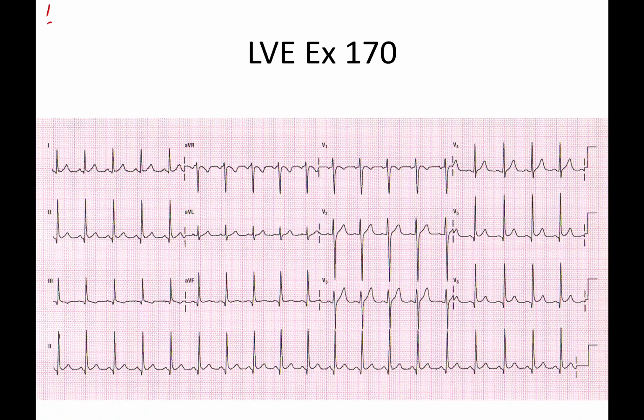So 1, 2, 3. We have a rate of 110. We are in sinus tach. Where are we at with our axis?